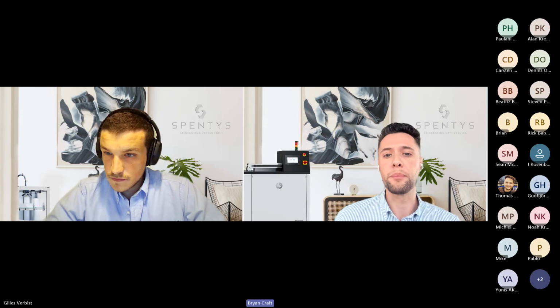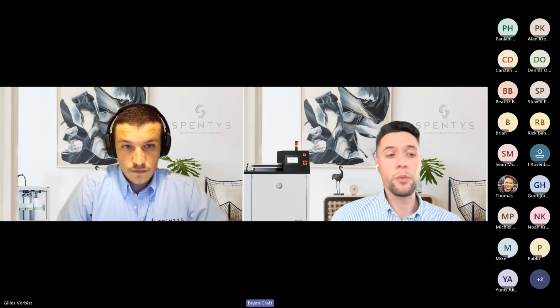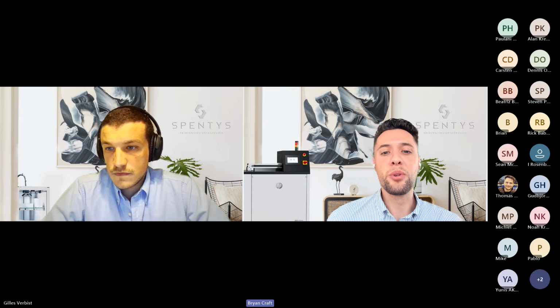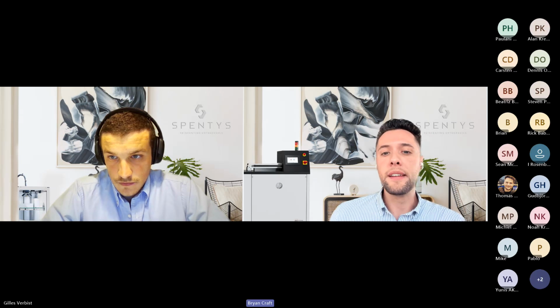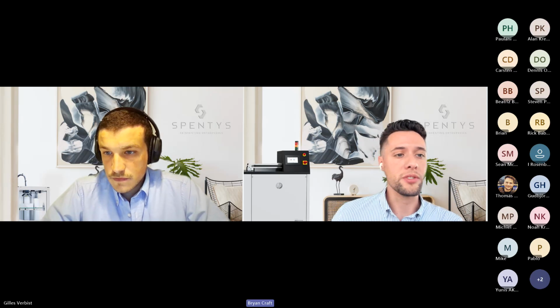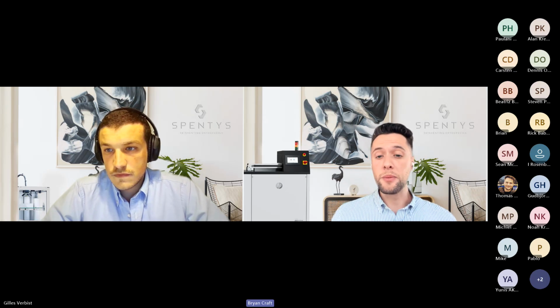Can you create a shoe last and print the positive, or mail the positive? I think the answer is yes. I think by the end of that demo, you saw where that shoe, we call it a mold. We could also call that a shoe last, but if you'd like to explore how the tool can create your shoe last, let us know, and we'll definitely put that trial in your mailbox. Superimposing the scan, I think maybe that question was asked before you started showing what the mold in the scan looked like superimposed. So yes, we could do that.